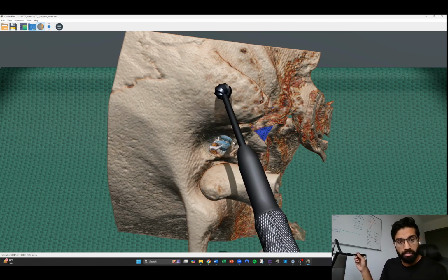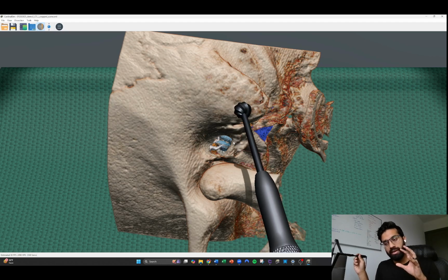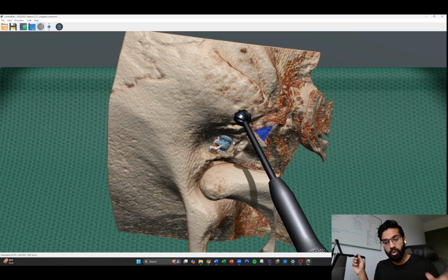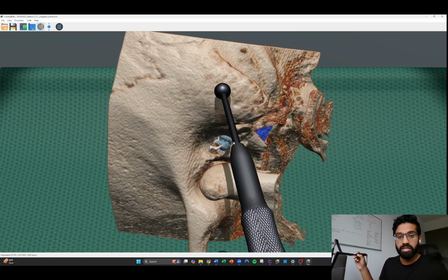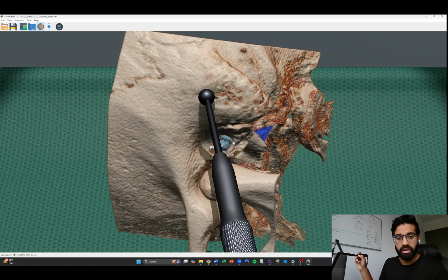Furthermore, it's not even just like looking at the CT scan. I can actually manipulate it and learn what this patient's anatomy is going to look like and feel like over the course of the procedure, right? And so I'll start by drilling into the mastoid here. And what's happening, I'll narrate over the sound of the drill, which you hear.